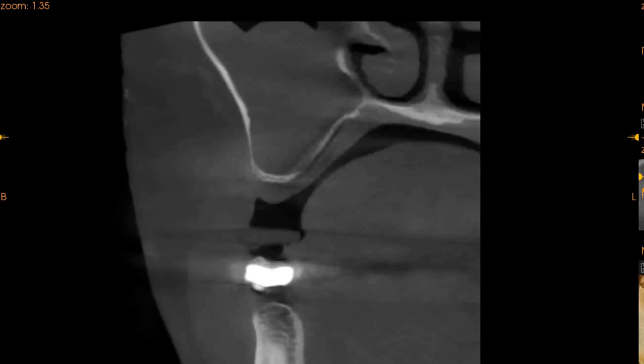This is that extremely radio-opaque material. We did not figure out what this might be. It's not directly into the sinus, but it is palatal, and it is underneath the mucosa. This is the mucosa where we can see. So we would be really interested to figure out what this might be. And then moving on, we can see that there is extreme sinusitis in the right sinus, especially that can be seen on the CBCT.